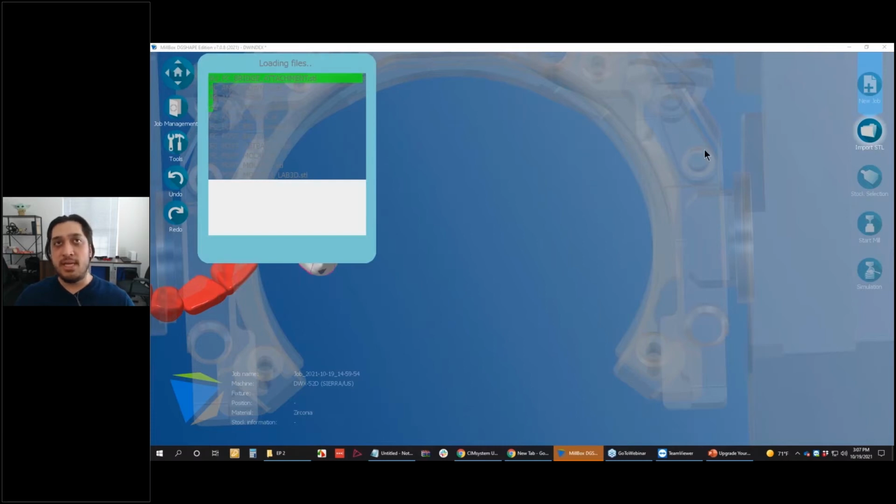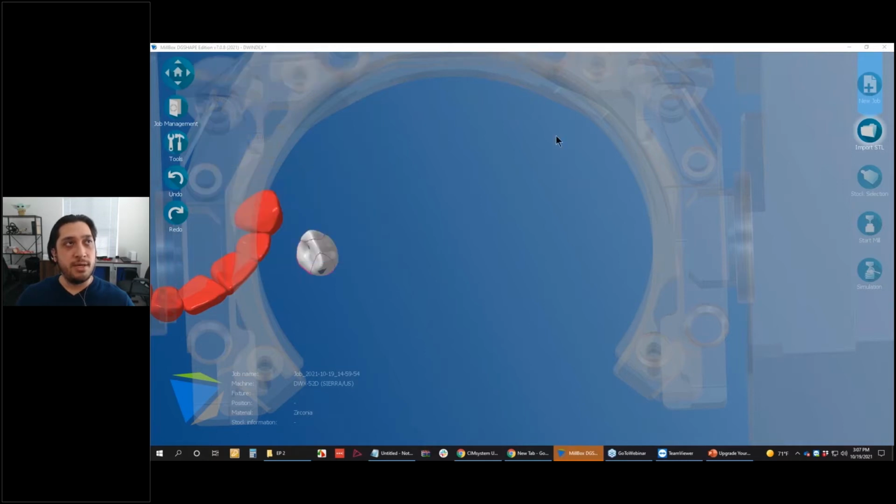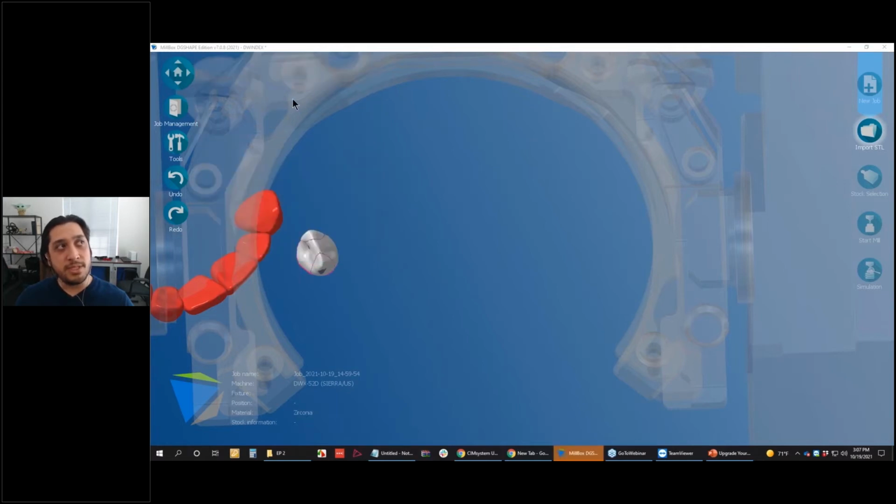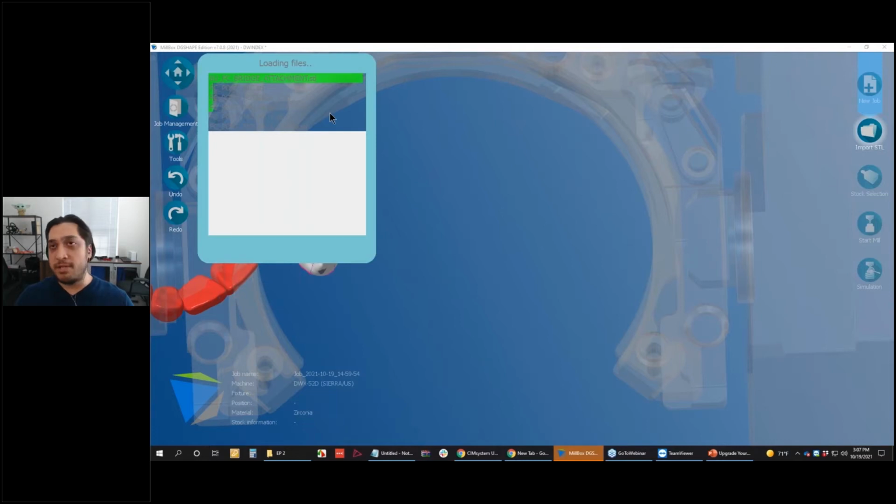But you can see the importance behind needing to be able to queue those up, so that way they can import really at the same time and pull those files all in sequence. So it's actually done importing most of these. I think we've got a couple more loading on the back end here, some of these cutback bridges and stuff, but that should finish up here very shortly, and then we'll move on.